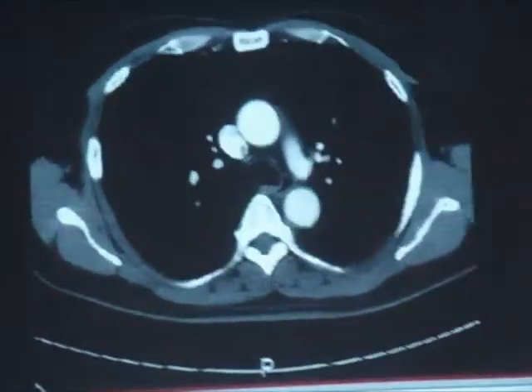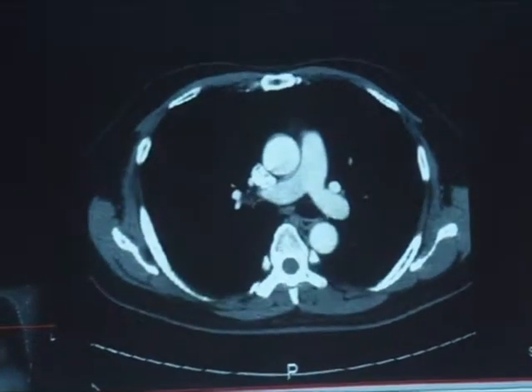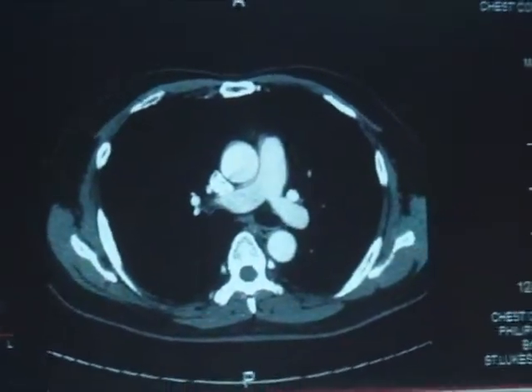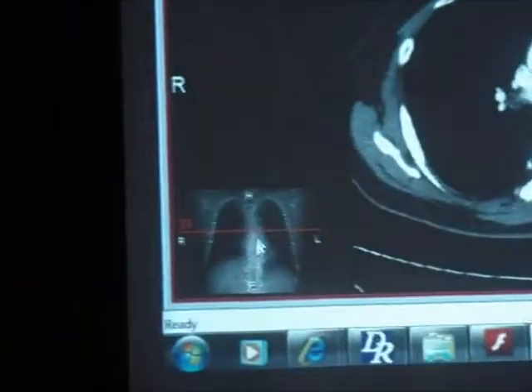Anteriorly, descending aorta posteriorly, and you see what's emerging. That's the pulmonary artery. So the main right and the left pulmonary artery. Okay, you have your ledger here. Okay, we're going from top to bottom.